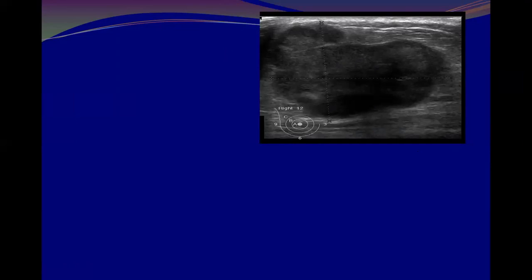Where are the microlobulations here? Multiple lobulations. And large. This is one lobule, and this is another, maybe 3 large lobules. Here it's, yeah. What is your impression about these lesions? Since you have seen it, what could it be?